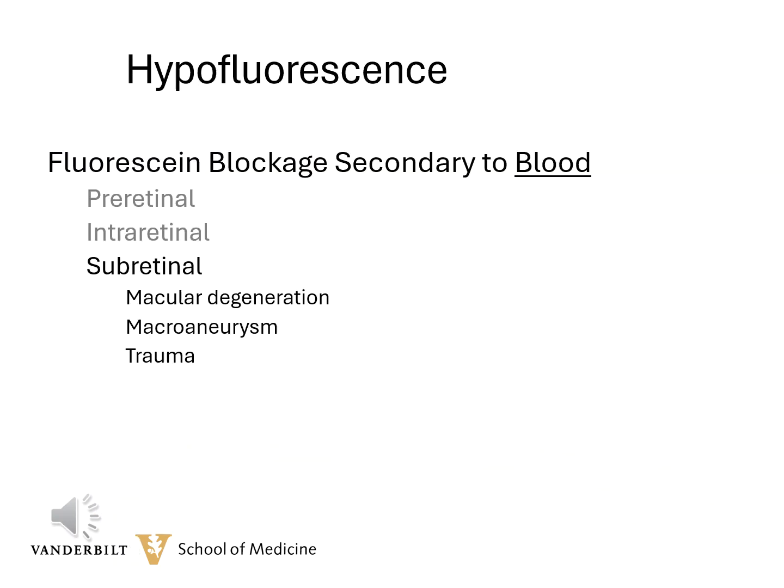The most common reason for subretinal hemorrhaging will be choroidal neovascular membranes associated with macular degeneration. Other causes of subretinal neovascularization can include histoplasmosis or any condition which can break Bruch's membrane, thus allowing the capillaries from the choriocapillaris to grow into the subretinal space. Macroaneurysms can also bleed under the retina, as you have seen in a prior example, and obviously trauma can cause subretinal bleeding as well.